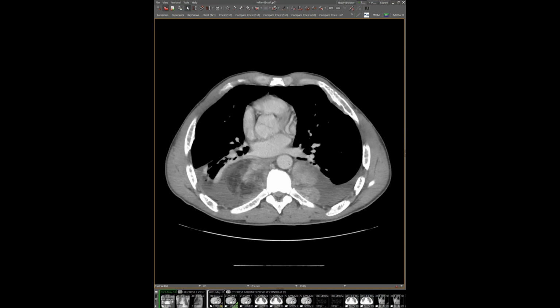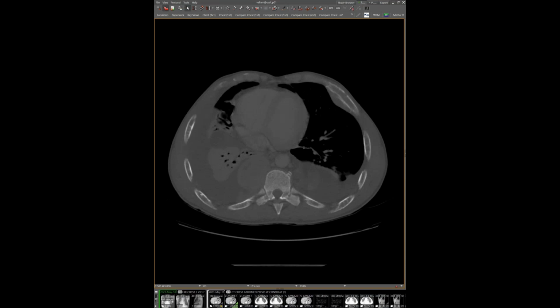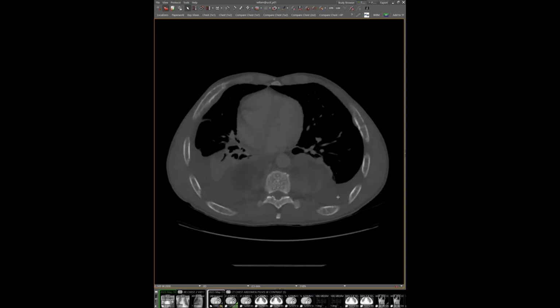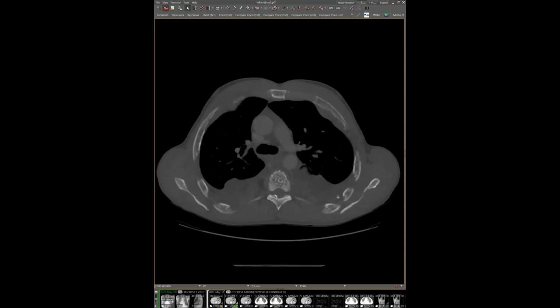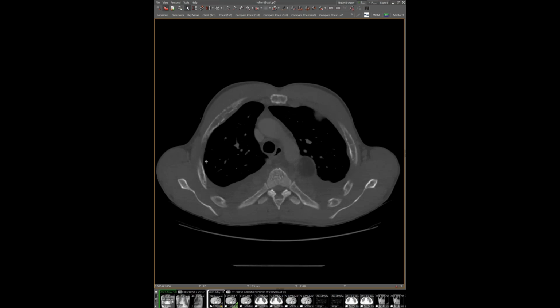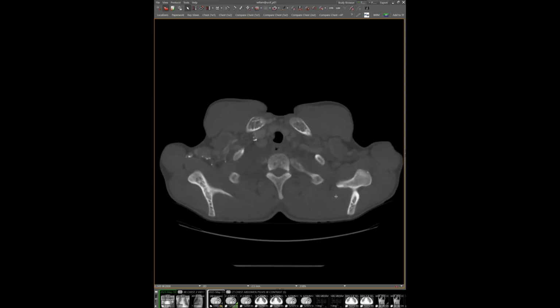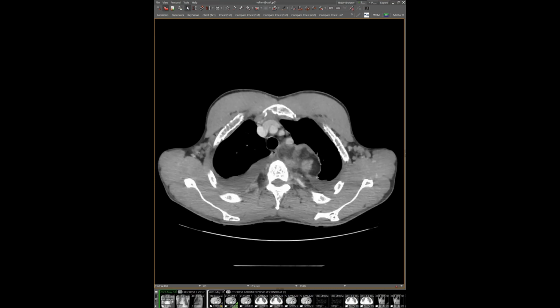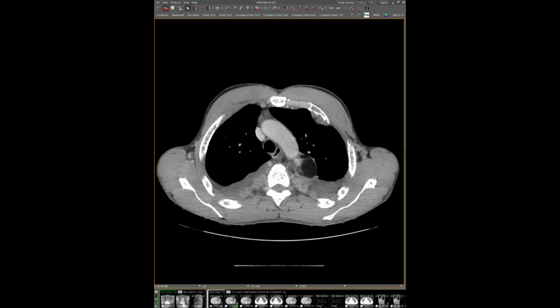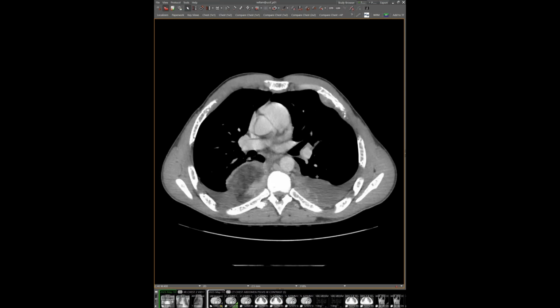And then if we actually look at the patient's ribs and bones, we can see that they're pretty markedly abnormal. This patient, I think, is maybe 40 years old, so relatively young, and we can see all of this abnormal osseous appearance. And so this is a patient who has beta thalassemia, and what these end up being are extramedullary hematopoiesis. This was just the most dramatic case of this that I have seen in quite a while.